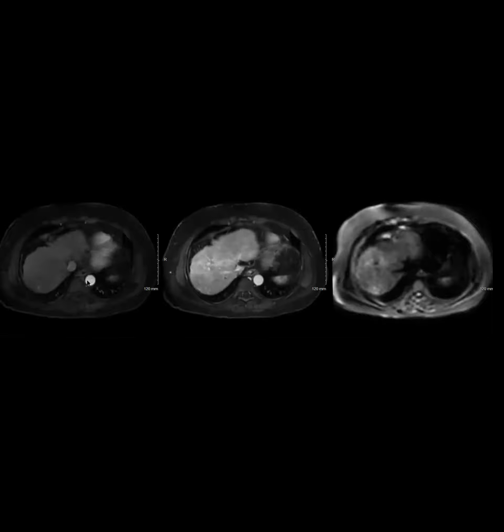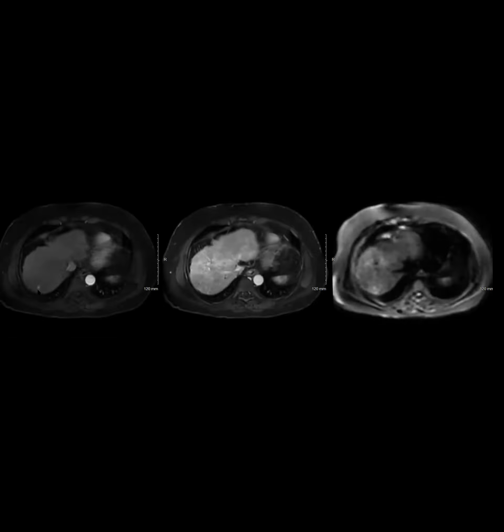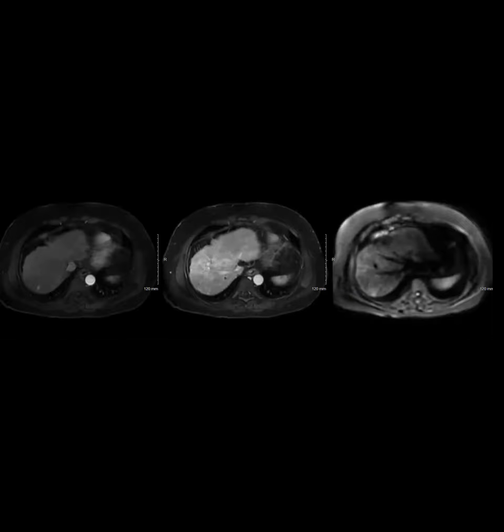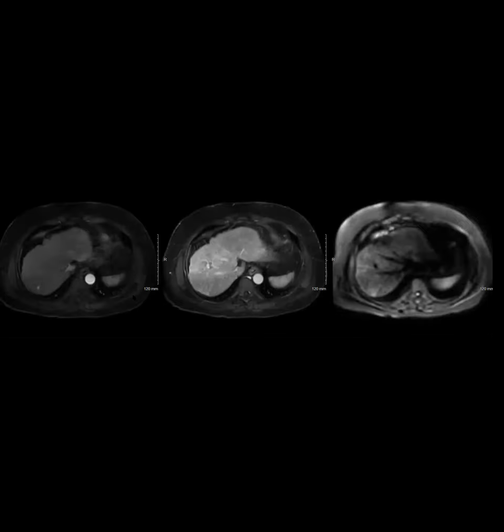If we were to apply LI-RADS, based on major features, there's no washout, it's 8 millimeters. We would go with LI-RADS 3 based on major features. We can kick it up to LI-RADS 4. It's a tiny lesion. Anyway, the concern was that the path on the explant came back as a 1.2 centimeter combined cholangio-HCC.